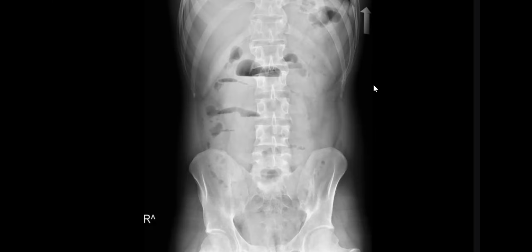Okay, I still cannot see any pneumoperitoneum, so my next step will be asking for CT abdomen with contrast to search for the cause of obstruction. And also on the plain X-ray, I should check the hernial orifices. Yes, important. I don't see the groin, maybe a hernia. It's not seen on this X-ray. However, my next step after checking the upper abdomen, the lower chest and the groin would be CT with IV contrast to search for the possible cause of this obstruction.